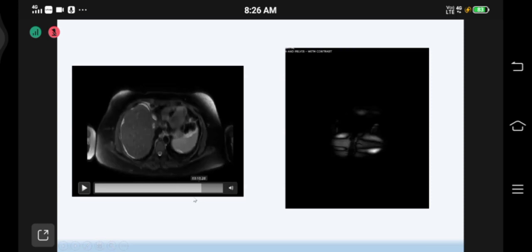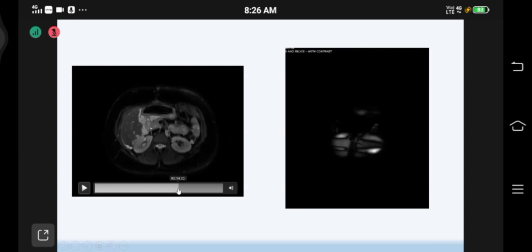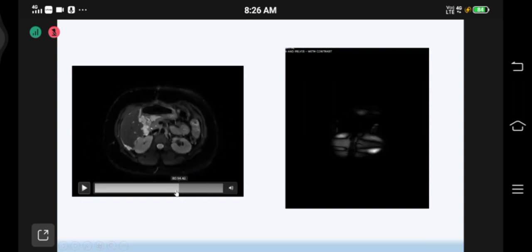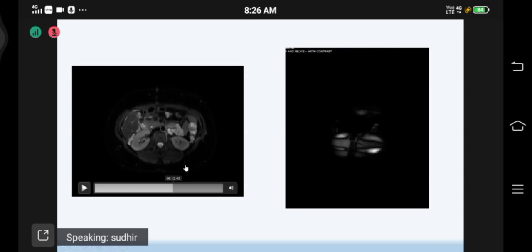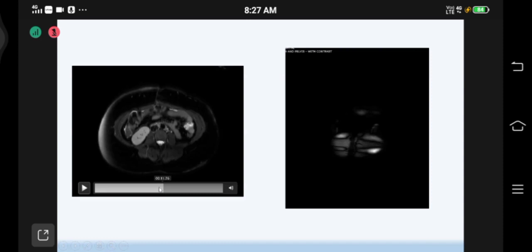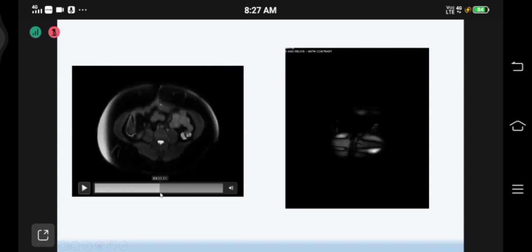then goes to the subdiaphragmatic space on the top, and then coming back to the falciform ligament, then hepatoduodenal ligament, then we come to the midline, then goes to the left perisplenic area. I hope you're able to appreciate this icing kind of lesions on the spleen. Then when I come down here, you can see the left paracolic gutter. You can see there are nodular deposits here. And so as I come down, left side of pelvis, and then back to pelvis, right?